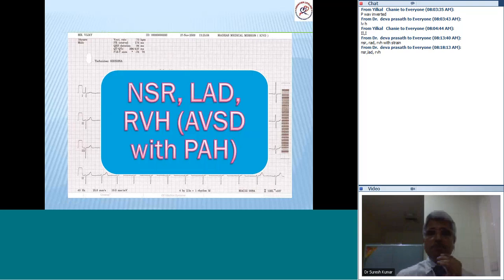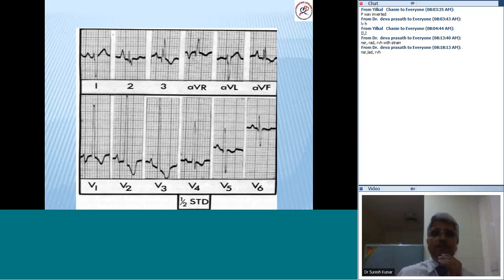Now look at this. What does this show? I'd be happy if I get more responses.